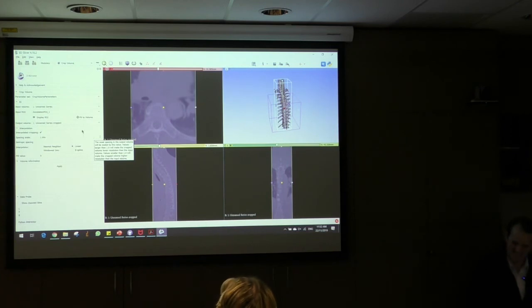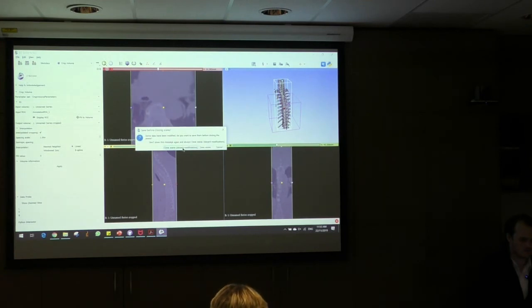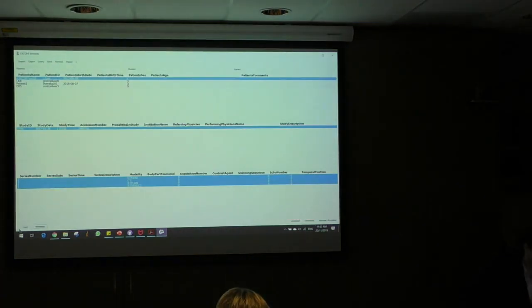I'm going through the checklist. I will reopen this patient now, and we'll go into the next scene. Give me 2 moments. So just closed and reopened.